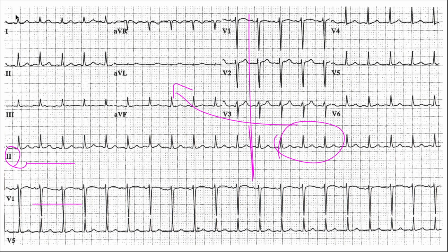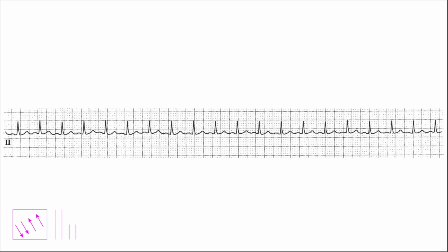Just when you're taking screenshots of ECGs on your machine, be mindful of that, right? Just because you captured something over here, you might want to take another ECG where that change is present in all 12 leads, right? It always helps to have more information versus less.